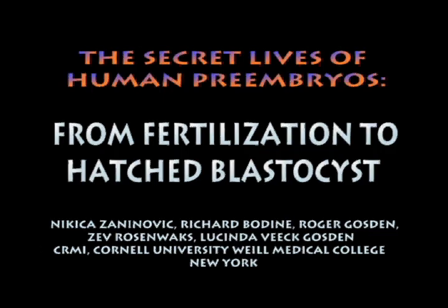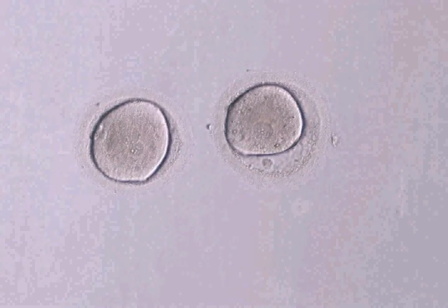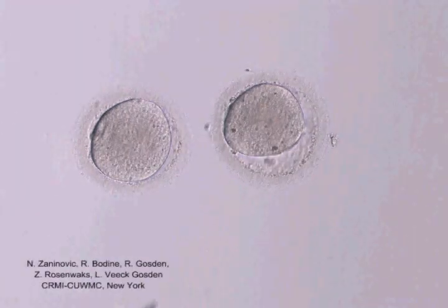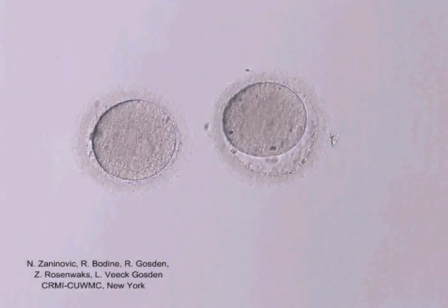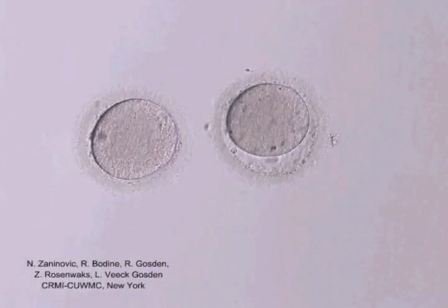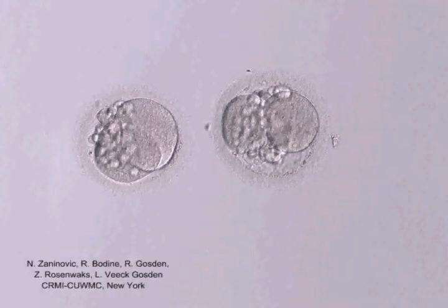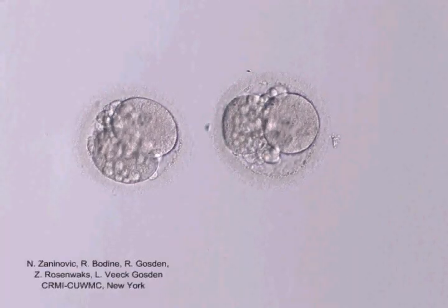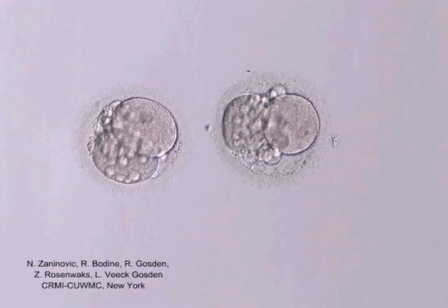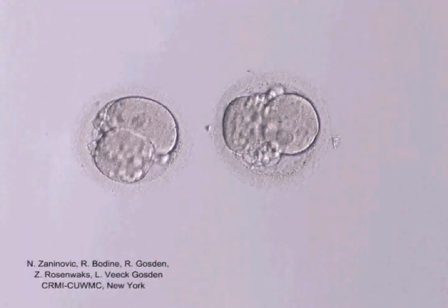Human frozen-thawed pronucleate oocytes donated for research were cultured in sequential medium that was changed every 2 days. 2 frozen-thawed pronucleate oocytes are in view, showing cytoplasmic streaming and organelle movement, especially the nucleoli. As syngamy approaches, the pronuclei disappear, and a cleavage plane forms parallel to the pronuclear axis. The 2 daughter cells are at first irregular in shape during completion of the first mitotic division. Cytoplasmic fragments form primarily at this stage, some of them becoming reincorporated, but others may persist.